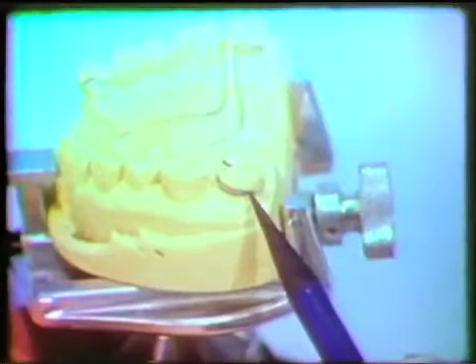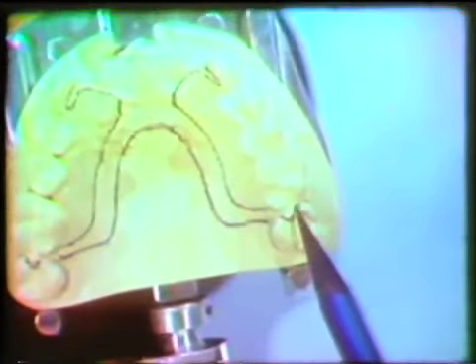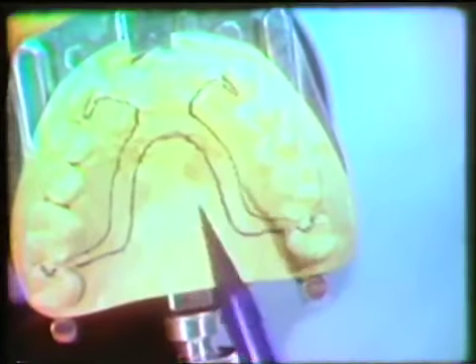Circumferential clasps engaging distobuccal undercuts on the molar teeth are selected. The usual type of occlusal rest preparation with adequate depth will be made on the second molars in the mesial fossa. Notice that the major connector is designed to be at least 6 millimeters away from the gingival margins of the posterior teeth.